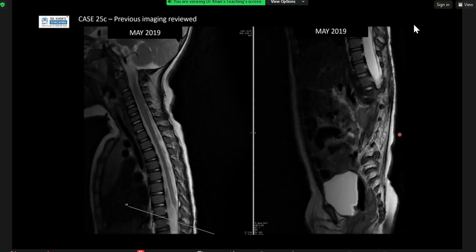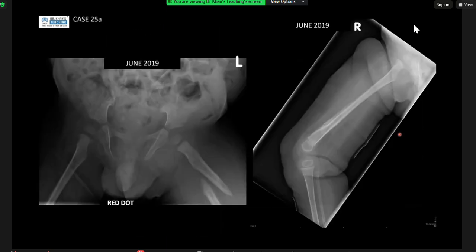So are you still going with pathological fractures? Sorry, it's a difficult case. Essentially, what I was trying to show you was on the line of insufficiency fractures. I like the fact that you thought so, so let's go back to what you said. There is no metaphyseal lesion here. Yes, there's a little bit of irregularity here. I just wonder whether it's due to his position or whether this could be some sort of heterotopic ossification from some of the treatment. But the metaphysis is clean, your epiphysis is clean.